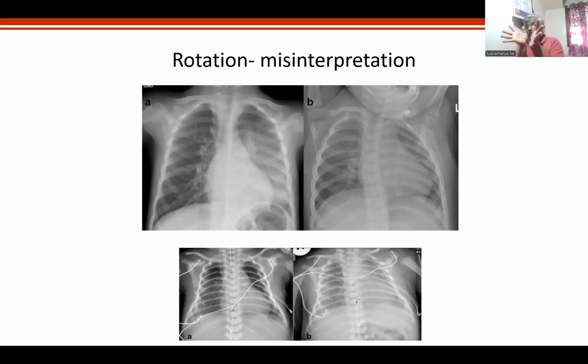I'll repeat. Whenever you rotate this way, this is the left lung, which appears more lucent because all the radio opaque structures come closer to the center. Here, all the radio opaque structures spread to the periphery. This can be mistaken for foreign body. I have seen bronchoscopies being done for want of perfect rotation. Type L if you like this, because you should not suspect foreign body by unilateral hyperlucency without checking the rotation.